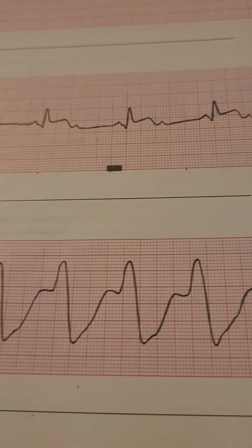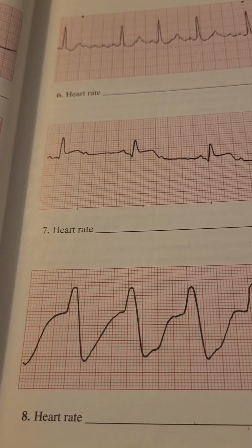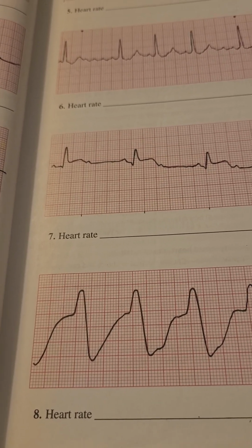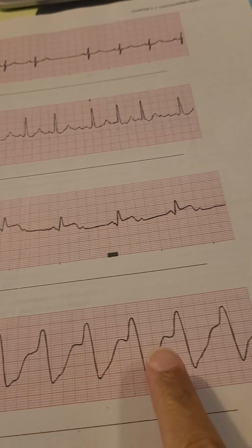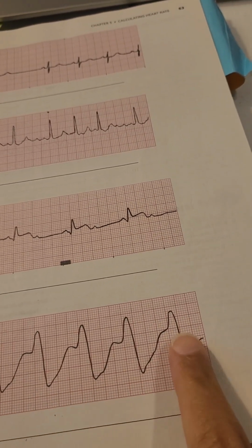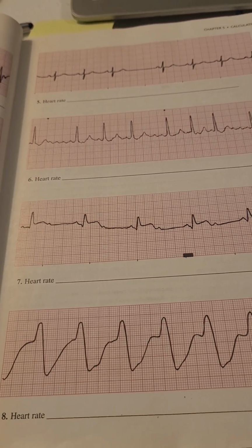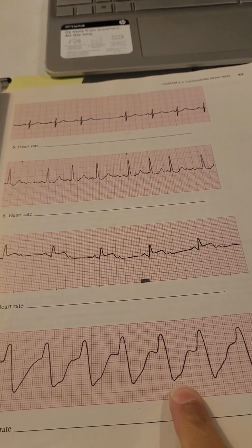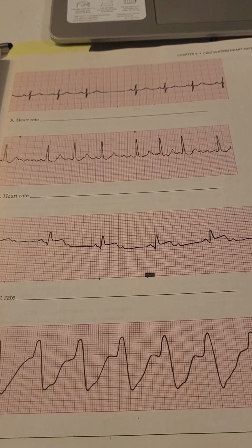So that's that. This one is also a rhythm. It's not a good one, as you can tell. Anything that's wide and bizarre is, for the most part, starting to get lethal, where the patient is in critical condition. It's not looking good. So it's still marching out for now. If we don't get help for this patient, it's not going to look so good. 1, 2, 3, 4, 5, 6, 7. 70 is the heart rate for them. It's regular, but it's a ventricular one. Like I said, I'm going to get into the different names of the rhythms.